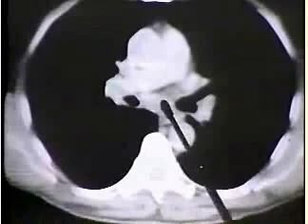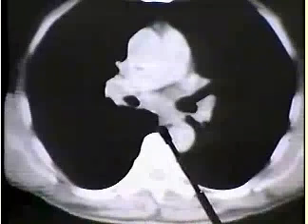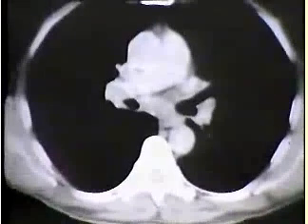But once again, the esophagus is back here and is not likely to be displaced by even so large a node. Furthermore, the azygoesophageal recess is not significantly encroached on or deformed by this very large metastatic lymph node. Therefore, one finds that one's sensitivity for abnormalities is greatly increased by looking at this region on the CT scan.